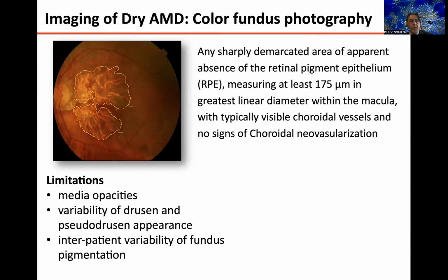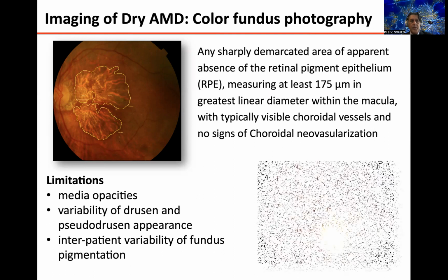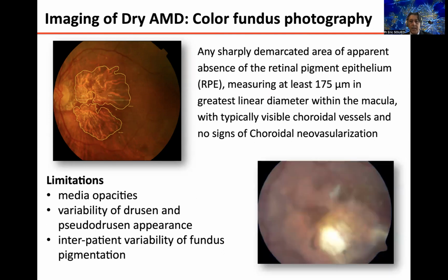The limitation of fundus color imaging is the media opacity, the variability of drusen and pseudodrusen appearance, and interpatient variability of fundus pigmentation. Here is an example of a patient with a wide cataract.